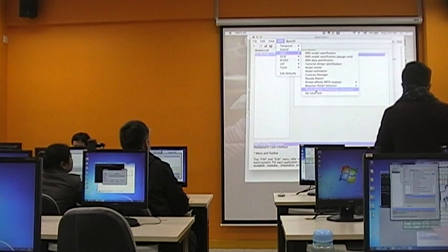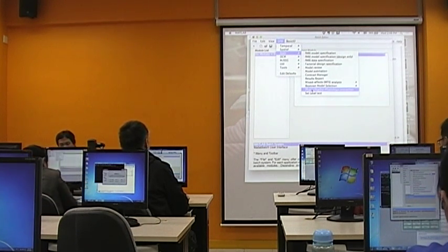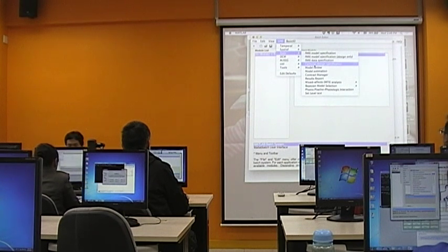And also you could have PPI, but for PPI, I would recommend you to go to see the SPM manual, because there are some step-by-step instructions you could follow to do PPI. So if you are really interested, then you could try yourselves. But the most important thing would be this one, fMRI model specification, as well as the factorial design specification.